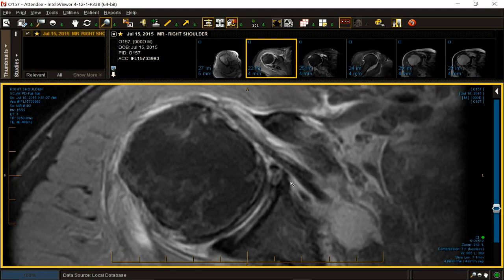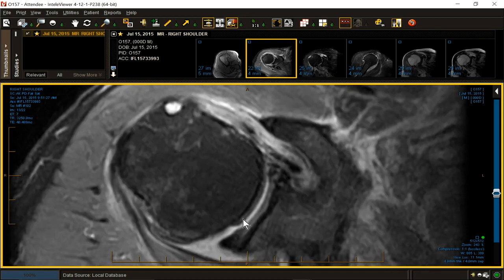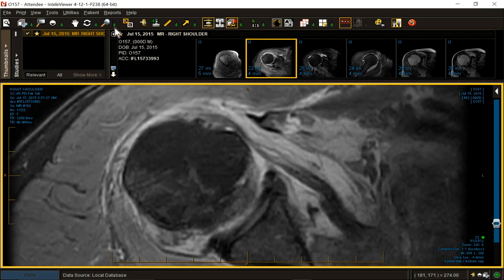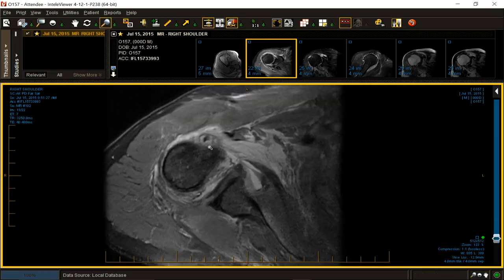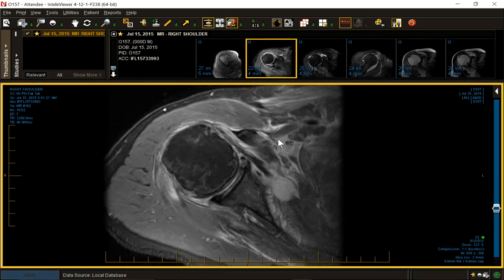Common. Don't touch it. Joint space? Chondromalacia. That's called living. How about a fracture? She fell. Nope, no fractures. How about rupture of the capsule? Yep. That's how all that fluid got out there.